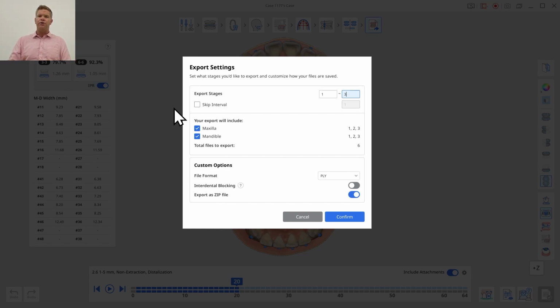When I confirm here, you have 2 options. You can either have a monthly plan if I'm going to be downloading STL files, which allows me to download as many files that month as I choose, or I can pay per aligner file and only download what I need. So based upon your selection on that, it'll prompt you either to download those files or to pay for what section you have.